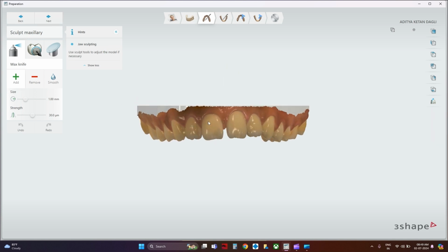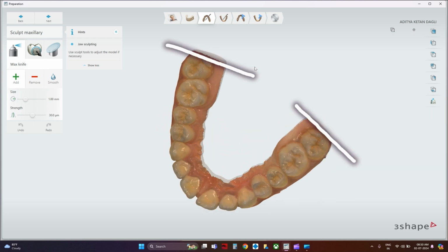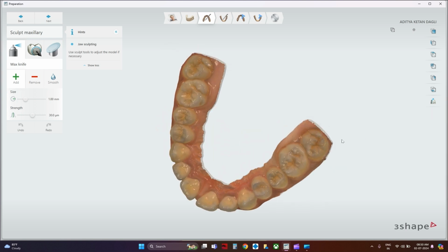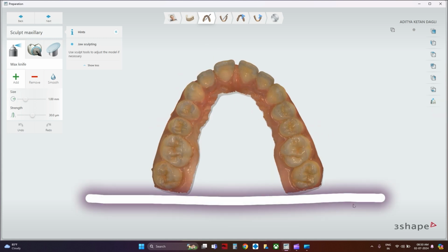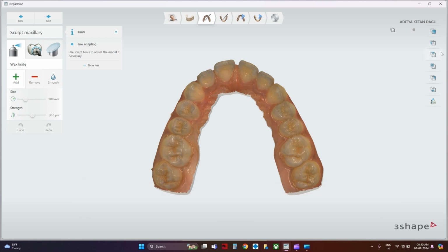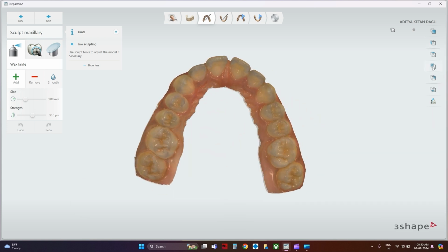Then the moment you go into the sculpt mode, in this step, if you're going to be vertically printing it, you will notice that the distal most ends are not flat entirely. So what's going to happen is if you want to load it straight on a 3D printing plate, or the printing plate of your 3D printer, it's not going to align very well. So at this stage, you take it into the side view, one of the side views.